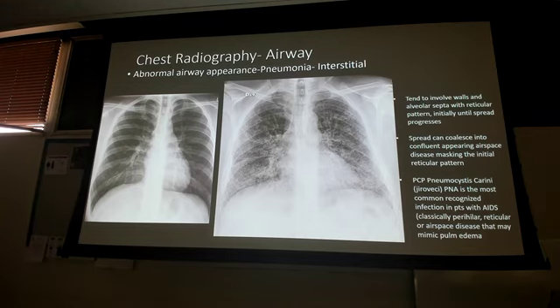So, got that one. Now if I go from segmental to interstitial, the difference with the interstitial one is not necessarily the fluffiness. Look at the graininess of the chest x-ray. This one looks like somebody threw sand on it and took the x-ray. And look at where it is. It's all over. Can I have both in my segmental? Sure, I can. But this one is like a bunch of dots, like a bunch of grains of sand. So yes, it's still fluffy, it doesn't have the distinguished borders that the lobar does, but it's fluffy in a different way.